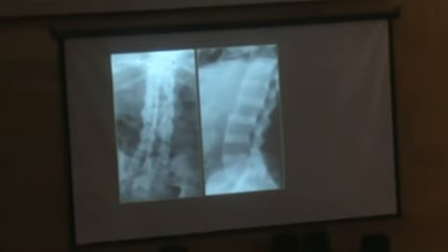Sometimes, without any important trauma, these subjects start to develop pain, another, unusual pain. We do an X-ray or any other imaging method, and you can see here extensive ankylosis with syndesmophytes. So it's a classic, typical bamboo spine.